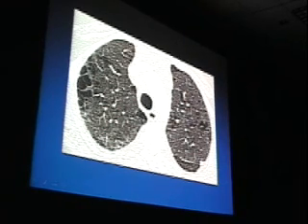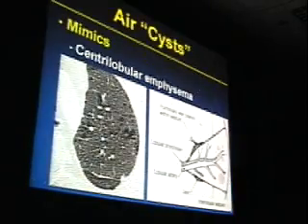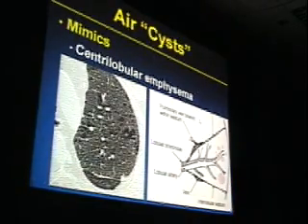Now let's look at this for just a second. This patient also looks like they have cysts, scattered throughout. But if we begin to look at this case fairly carefully, we would notice that the vast majority of these low attenuation areas do not have a discernible wall. These are more like punched-out lesions, very much as you would describe a punched-out lesion in a patient with myeloma, an area of lucency, without a well-defined wall. And this, of course, is an example of centrilobular emphysema.